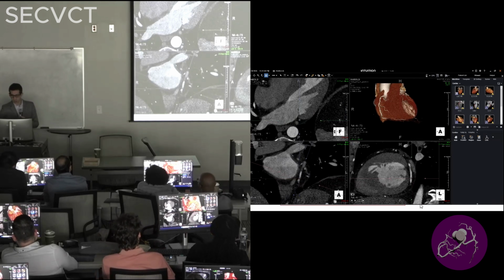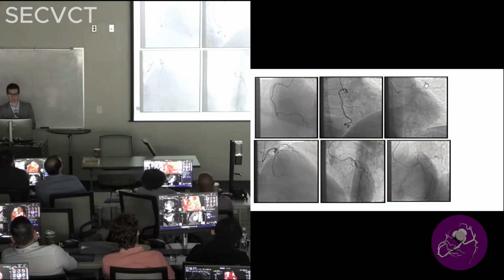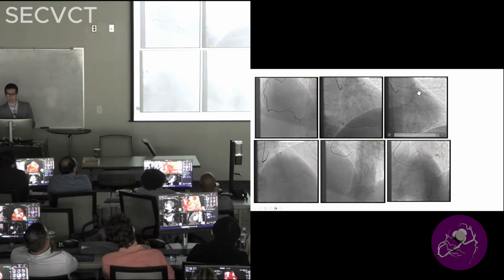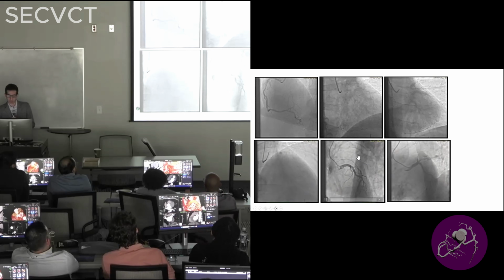Anyway, let me do a few slides on this topic. This is just for confirmation, showing you the anatomy. On the angiogram, you see this is the LAD completely gone, gives a big septal here and diagonal. And let me show you the OM we saw before. That's the lesion we described before. RCA was non-obstructive, just for the time.